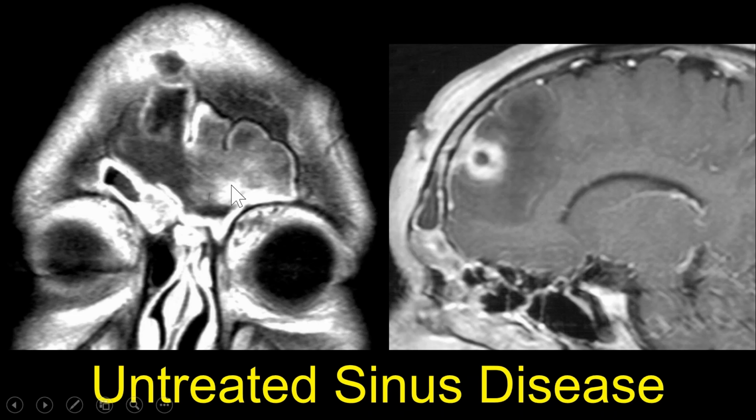So here's a coronal MR on the left side of your screen, and we can see complete opacification of the frontal sinuses. And on the right-sided image, this is a sagittal, and it's post-contrasted. We remember the nose. If you look at both of these images, the nose is bright. The nasal mucosa and the turbinates we see are very bright. So the nose.